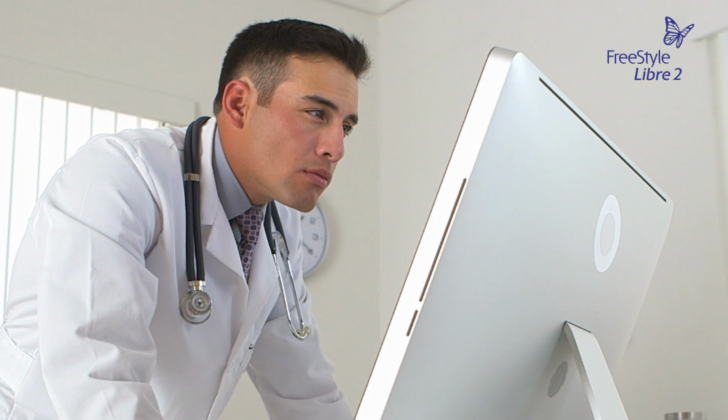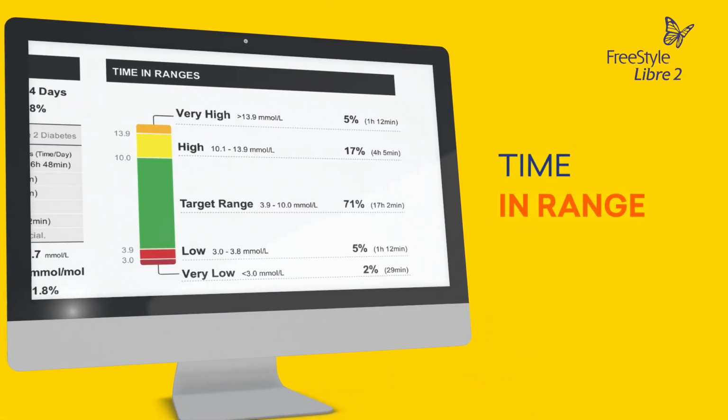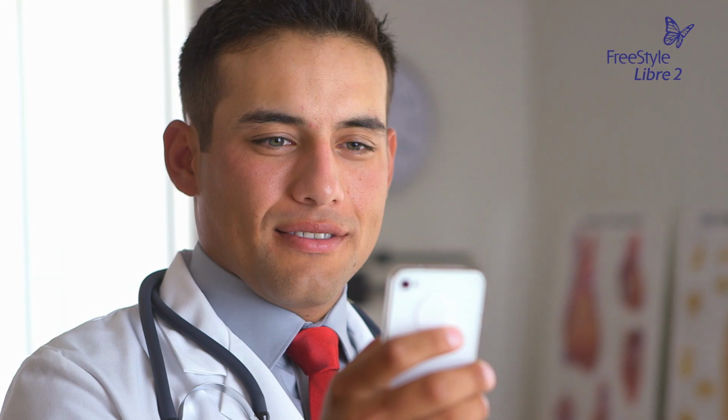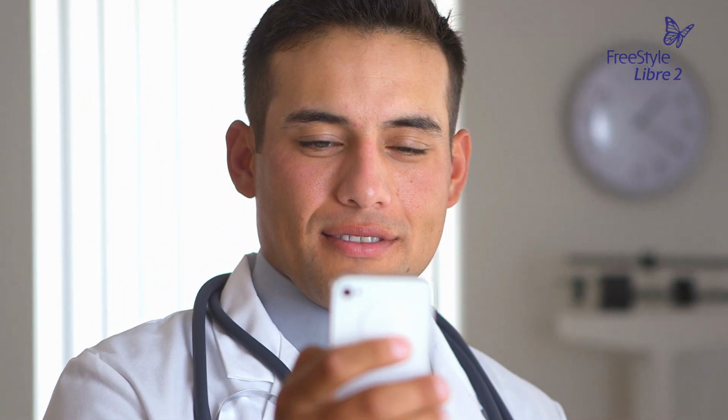Your doctor will use your reports, including time in range, to help identify glucose patterns and trends, so they can make more informed treatment decisions regarding your diabetes management. And they can use LibreView from any internet-connected device.